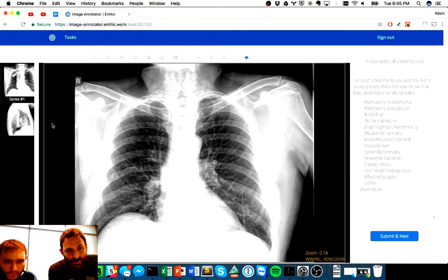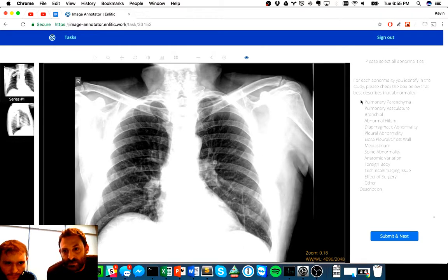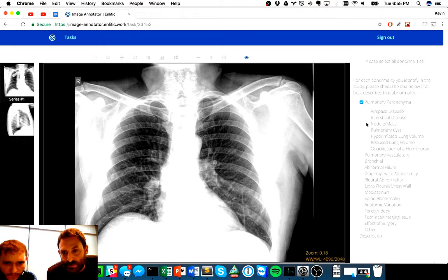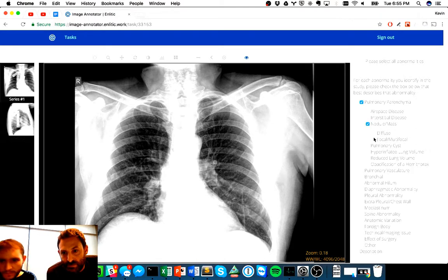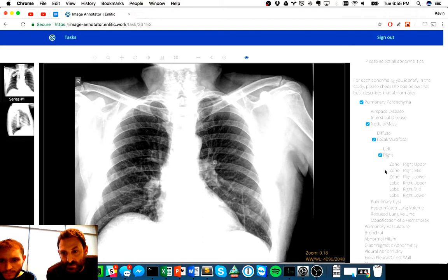See if we can localize that on the lateral view. So it's around the level of the hilum, so I'm unable to see it on the lateral view, so I can't ascribe it to a specific lobe. So we'll label it as pulmonary parenchyma, nodule or mass. It's a focal, it's in the right, and it's in the right mid-zone. There's also clearly ectasia of the aorta.